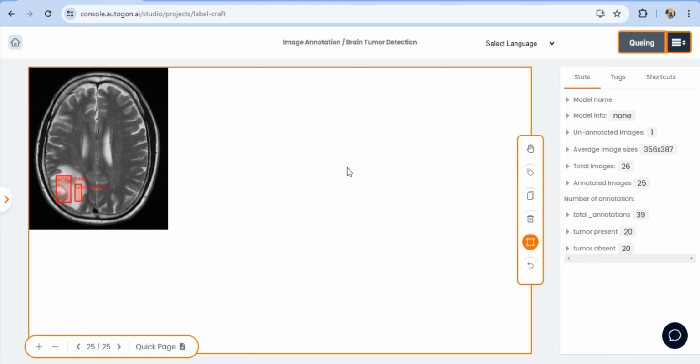However, you want to be careful. I left my epoch level at 8. It's left to you really on how you adjust your epoch level before you train your vision model, but you want to make sure that you are not overshooting that epoch level, because it could make your model overfit, and you don't want your models to overfit, because overfitting your model also means that it is highly prone to errors, and you don't want that for your model, right? So this is one thing you also want to look out for as you build.